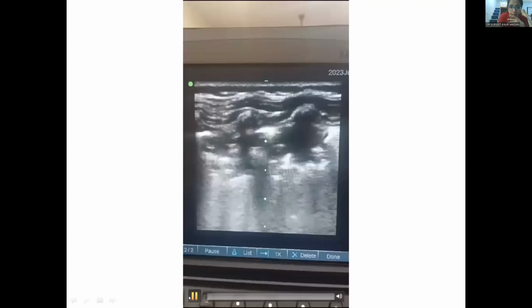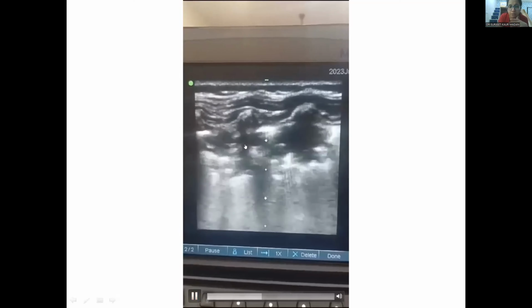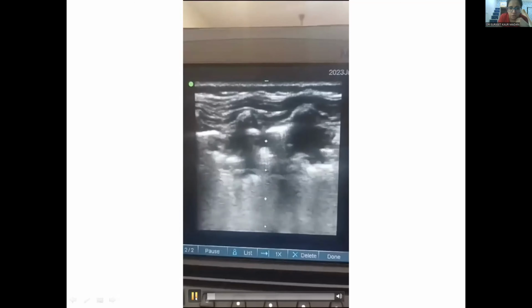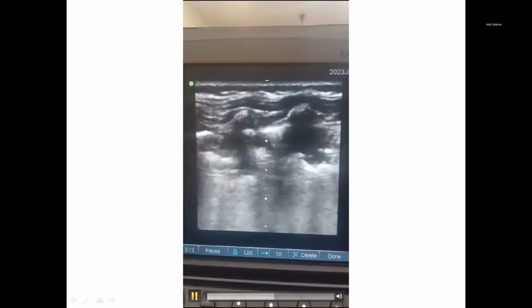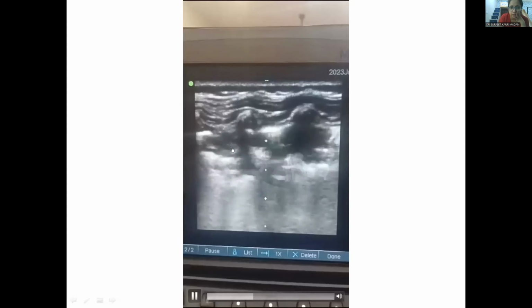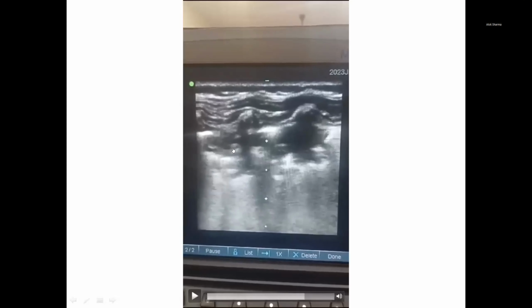Alok, how do I say these are air bronchograms? They look white, I mean blackish, and the fluid bronchogram is supposed to be echogenic, right? No, it's the opposite. The air bronchograms are bright because air is a good reflector, but fluid will let sound waves go through it. So often fluid will appear dark. So fluid will appear black, and air will be echogenic, white. So these are basically air bronchograms.